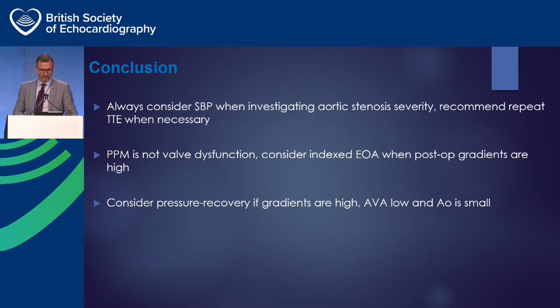heart. And if you're finding you have high gradients, the aortic valve area is low, and your aorta is small, always consider pressure recovery, but you don't always have to consider correcting the valve area.